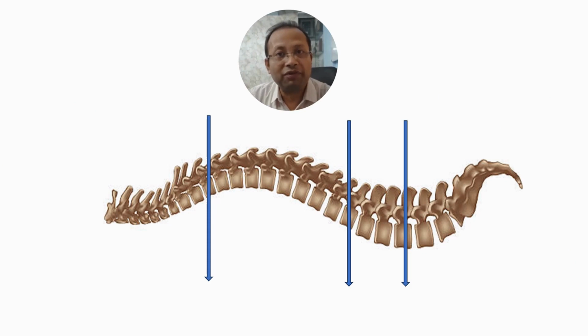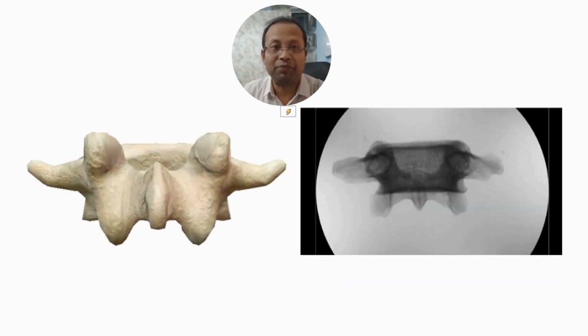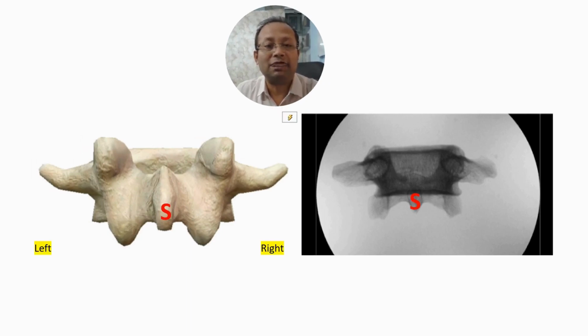Remember, the term true AP view concerns a single vertebra or even a part of the vertebra, for example, a single end plate. It does not apply to the whole spine because you cannot see a curved structure at 90 degrees at all points at the same time.